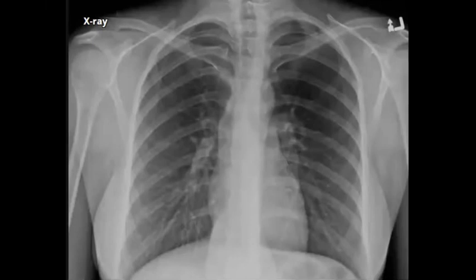Try to find it in the checklist. Maybe we can just try to remember the checklist. The first thing in the checklist, you will check for the lungs and try to find the hidden areas, and then you check for pneumothorax and any pneumo down, pneumo up, whatever, any air in the image, and check for pleural effusion, and you take the mid axis of the chest.